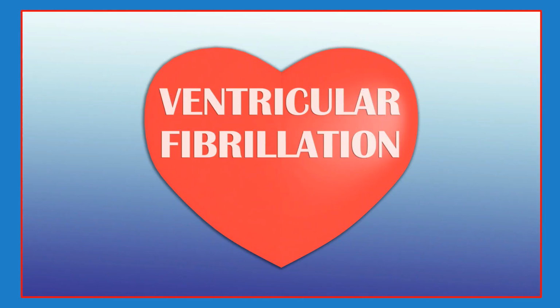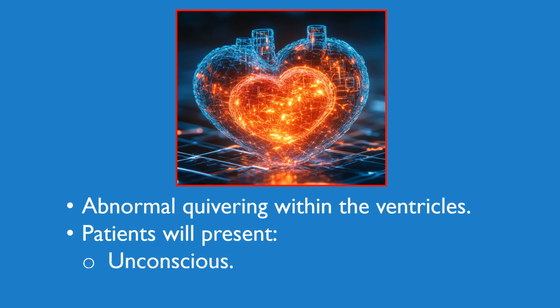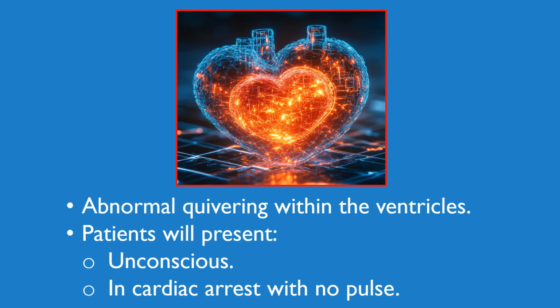Moving on to ventricular fibrillation. Ventricular fibrillation is an abnormal rhythm where the ventricles just quiver due to chaotic and unorganized electrical activity. Patients will always present unconscious and in cardiac arrest with no pulse with this specific rhythm.